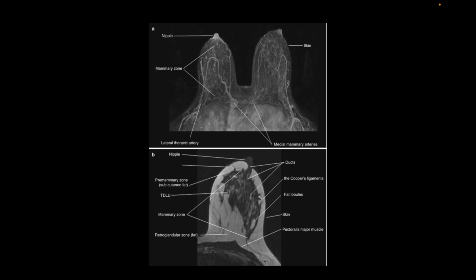They do MRIs of the breast as well, and they look like this. This is the left breast, this is the right breast. It's an axial image, and it sort of looks like the snail's eyes on top of their antennae is what someone once described it as to me. And you can see the same structure. So you can see the nipple areola complex, where the nipple and areola should be. Immediately posterior to it are the ducts, the retroareolar ducts, or just ducts. Then you've got the fibroglandular tissue, the skin, the pec major. All these other things you don't need to know for the exam. And then Cooper's ligaments are the thin structures if they show you.